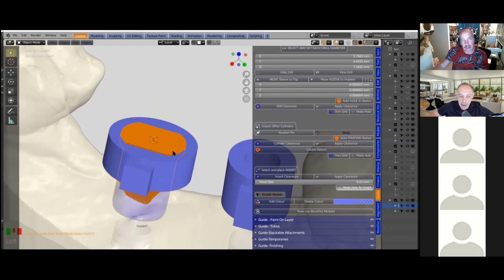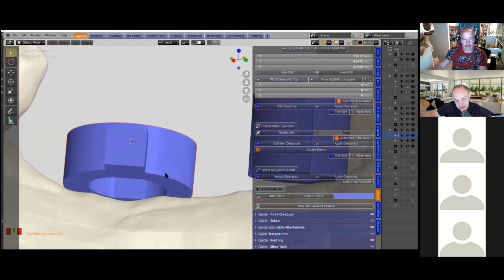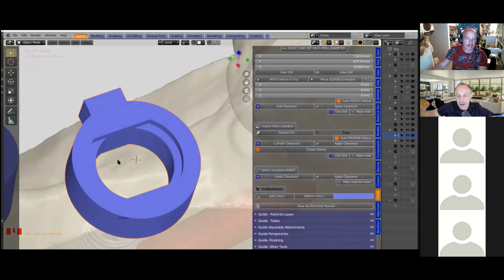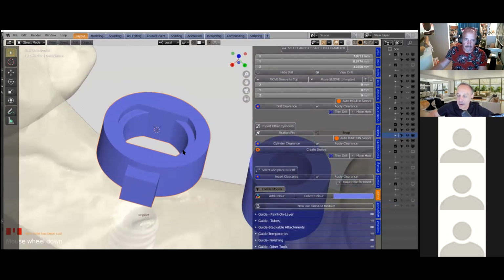So the Stecco guide sleeves are usually around 5 millimeters long. So in this specific application for this sleeve, you would find that the metal sleeve is a little bit long. And Michael, that would have to be cut then. Alternatively, we could have set the offset a little bit higher and then made it longer.